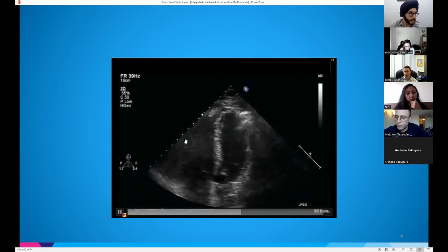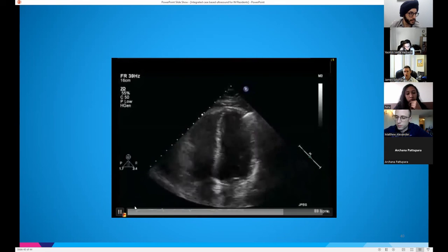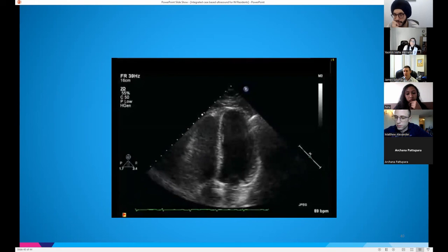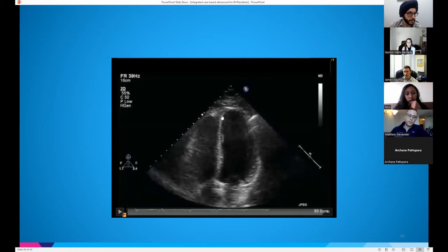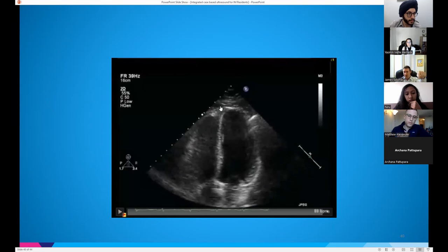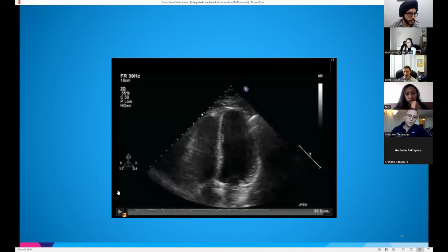That pressure overload dilates the RV. You then have hypokinesis of the free wall to compensate, because now you have decreased cardiac output from the right side to the left side. The LV starts to increase its contractility. You become tachycardic, right? And so the muscular wall of the LV is pulling the thin apex of the RV. And so you get this pinching down. It's almost like putting your index finger on top of it, pushing it down. That's known as McConnell sign, right? Very clear, it makes sense.